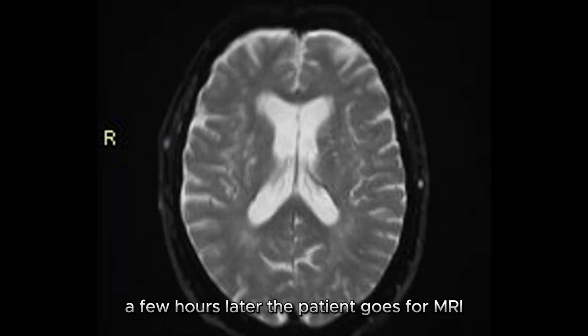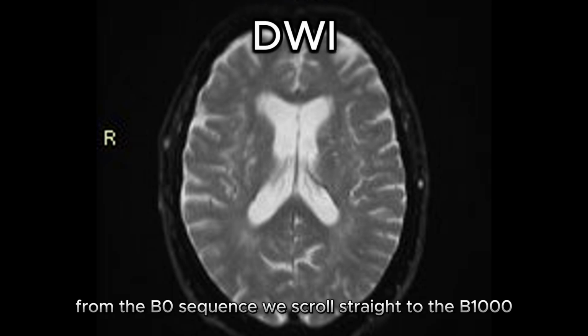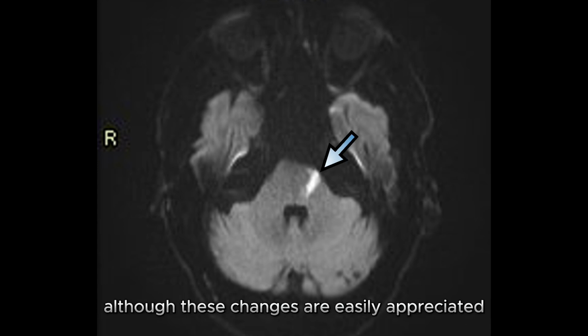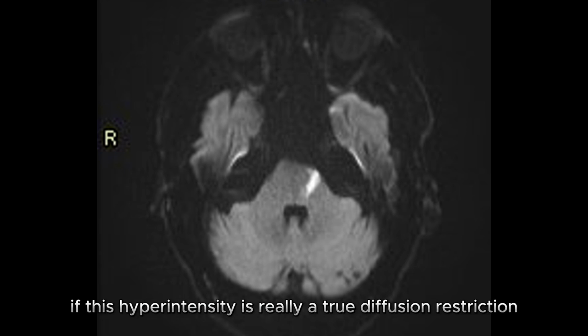A few hours later, the patient goes for MRI. The easiest sequence here to start with, as I mentioned before, is the DWI. From the B0 sequence, we scroll straight to the B1000. Here we can see a hyperintense signal in the left pons. Although these changes are easily appreciated on the DWI, we need to make sure to check if this hyperintensity is really a true restriction or not.